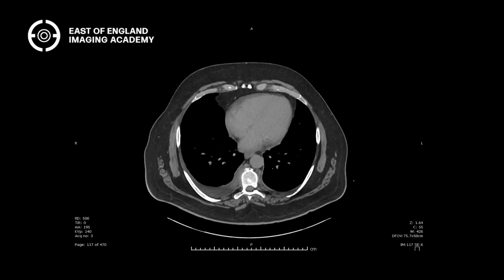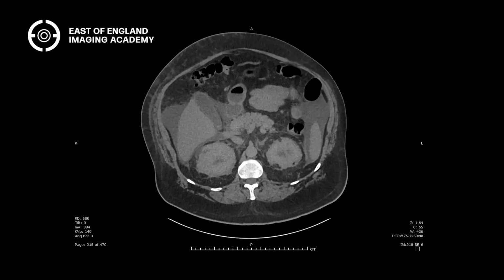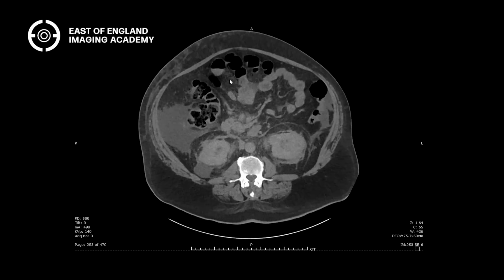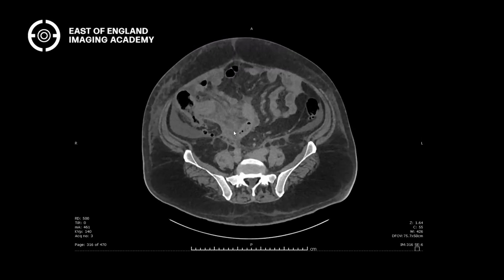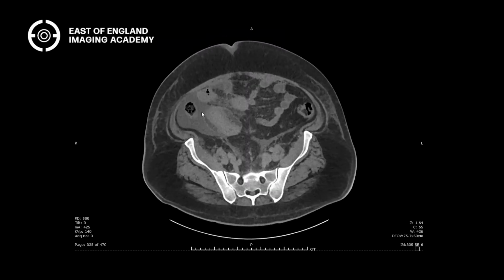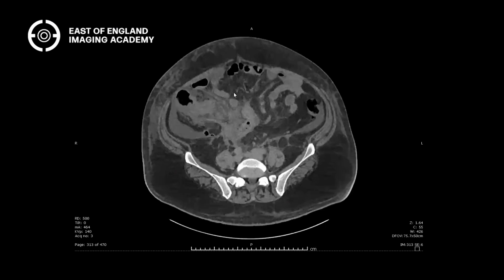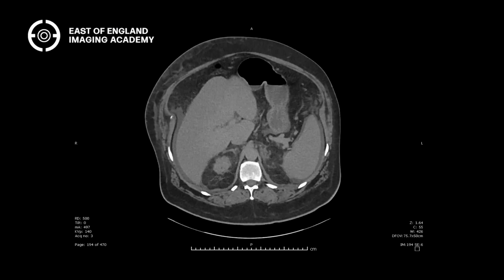This is a really complicated patient who's got a really rare diagnosis. This is Erdheim-Chester disease. The patient's got that, and they've also got CMML. They've got really weird stuff going on. They've got these weird hairy kidneys, which is a characteristic feature of Erdheim-Chester. They've got weird stranding in soft tissue and thickening of the terminal ileum, which is probably their CMML. And then they had a PET scan as well.